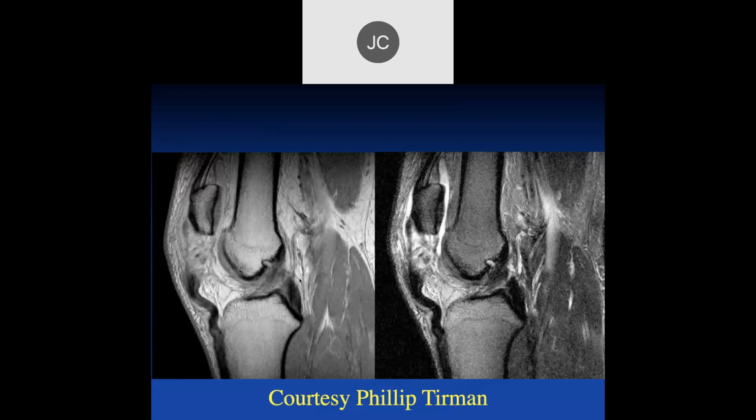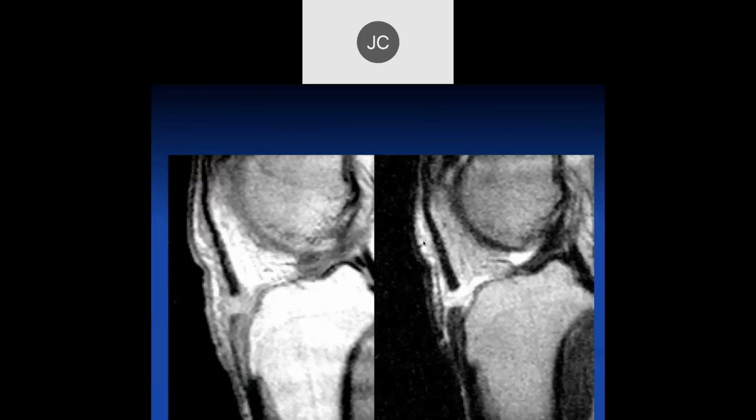All right. There's patella alta with avulsion of the proximal patellar tendon. Yeah, so it's really a complete rupture of the patellar tendon. I don't see any bony avulsion here. I think this was just a tear of the tendon at its insertion. Okay. Okay, and here we see a complete tear of the patellar tendon distally.